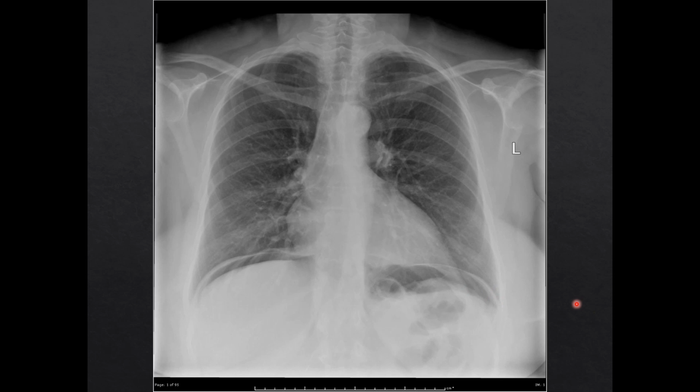Now, it's important to discuss at this point how we distinguish this from the pneumomediastinum or pneumopericardium that we've already discussed. And it's actually quite simple. Here you can see the air beneath the diaphragm. The mediastinum only goes down to the diaphragm itself. So if the air that you're seeing is underneath the diaphragm, then it is not pneumomediastinum. That continuous diaphragm sign is not talking about this, but is talking about when you can actually see air above the diaphragm and below the heart.